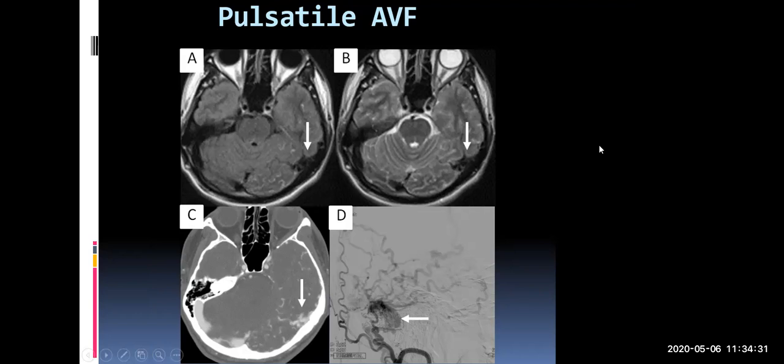This is sort of a companion image of what an arteriovenous fistula would look like. You can see on MRI sequences the difference, this bag of worms you're looking at, and the same on CT with contrast. There is a massive influx of arterial pressure into the venous side that causes engorgement of all these venous structures. And this is an angiogram of the same area connecting the two.